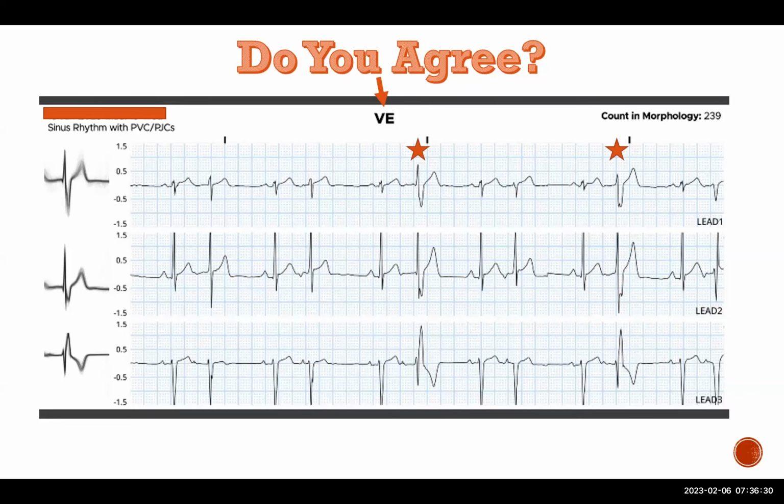Well, that's a good question. Is there anything about the timing of the A to A interval on that beat versus the others? I guess maybe there is some aberration. Right, this P wave relative to this QRS, this interval is shorter than this interval. A little bit, not a lot, but a little bit earlier. Notice how much isoelectric time there is between the T wave and the next P wave here, and between the T wave and the next P wave here, which is shorter.